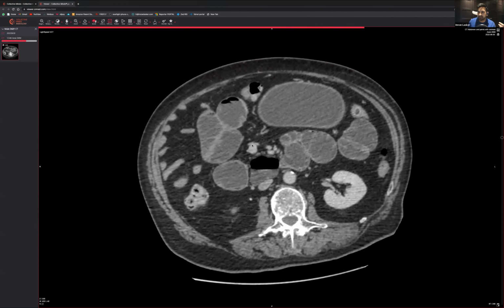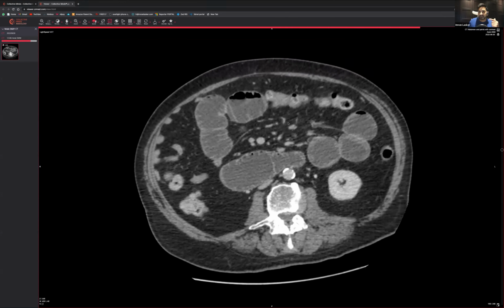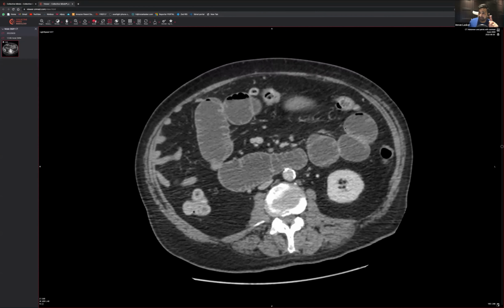If you follow that portal vein, it eventually splits into multiple tributaries and goes to the bowel. So if you've got air going along these tributaries all the way to the bowel, that must mean there's air being produced within the bowel that is now going up into the vessels. The only worrying situation where air would go into the venous system is if the bowel is dying.